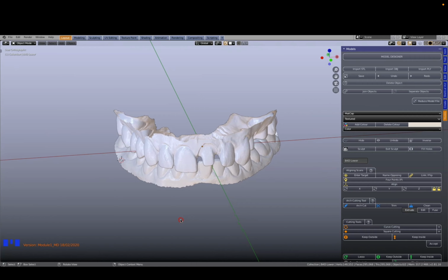As a starting point, it is best to first align the scans into the center of the 3D work environment. Aligning the scans will make navigation easier. It will also ensure your model bases are extruded correctly into a vertical direction. When importing scans, the scans can often be out of alignment with the X, Y, and Z coordinates of the 3D work area. Before we can continue with any CAD work, we will first have to rearrange the location of the scans to better suit the current environment.